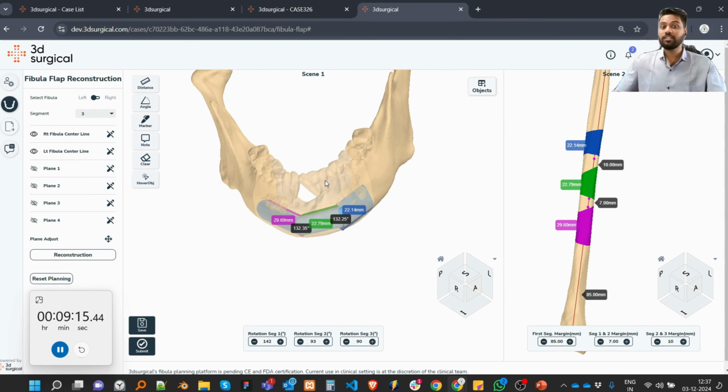The surgeon gets a notification anytime. Whenever the surgeon is available, they will open this plan, and if they are comfortable they can do the modification themselves, or they can suggest it and you can do it. But for you or for them, the modification takes just a second.